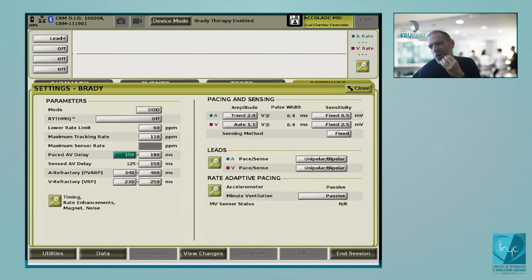Okay, obviously it works quite correctly now inside the atrium and also inside the ventricle for Boston devices. For the very first versions of this algorithm, it was imperfect, I would say. Now it has been considerably improved, and I think it works very correctly. If you program at least trend, you will have an automatic measurement of the threshold.